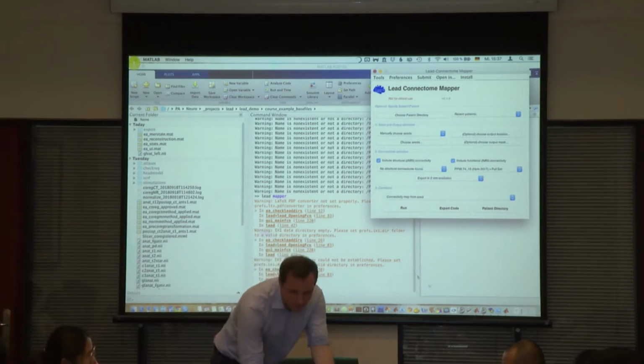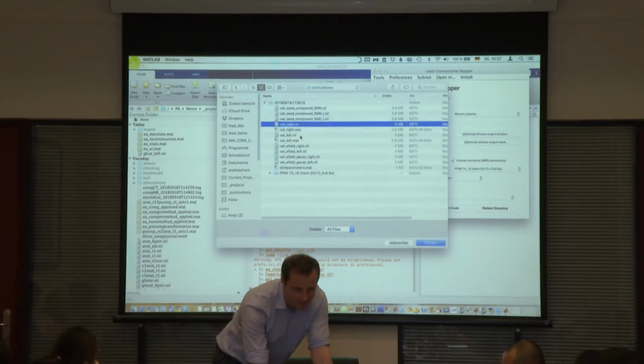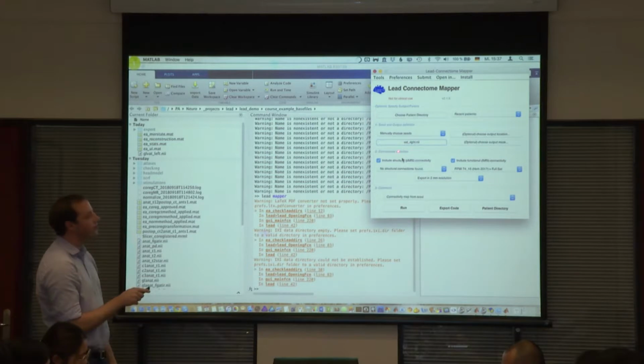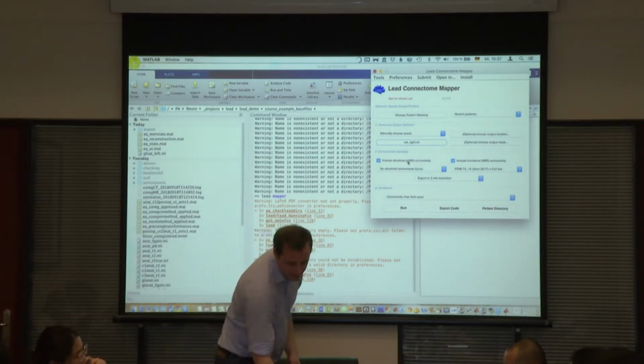So if I would just say I choose a seed and ignore the first, and I just use the right VTA of this patient, right? That would do a similar thing, but only take the right VTA. So I ignore this completely, but I choose the seed, and then I say again, run connectivity now.